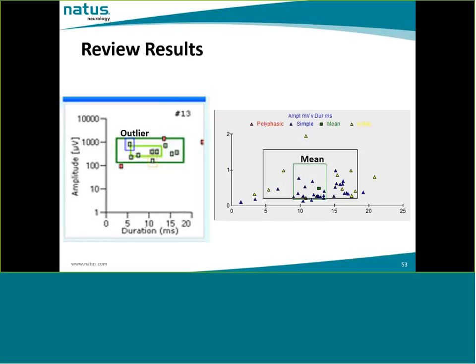And in this case, we have got a lot of data points over here. This square over here represents the mean value. The triangles are the individual measurements. Once again, I wanted to point out that there is a great amount of similarity between the two algorithms.